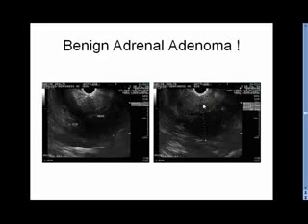But once you get to the 4 centimeter size range, you start worrying about, could this be something else, even if it looks benign, and a lot of physicians recommend at this size to refer for surgery. Now, once we knew that this was an adenoma and not a pancreatic cancer, the patient waited a little bit, but they finally decided to have surgery, and the diagnosis of a benign adrenal adenoma was confirmed. Interestingly, our colleagues often don't know that we can biopsy adrenal masses fairly easily, and there's certainly some indication which still needs to be done.